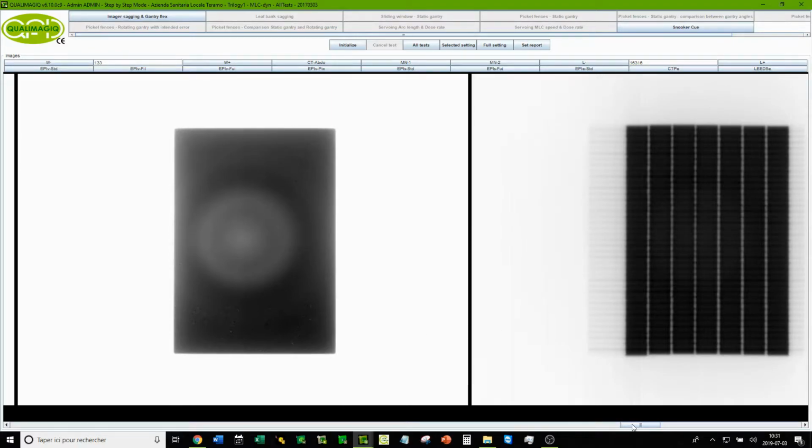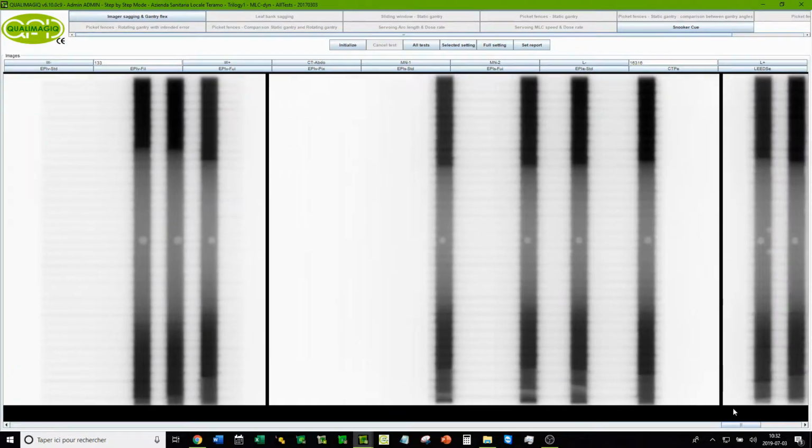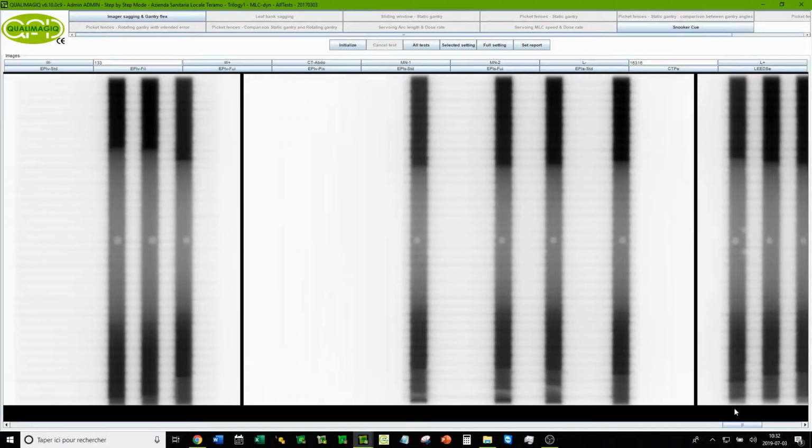The final and optional test is the SNOOKER-Q test. Our ISO test object is first aligned on the lasers and then deliberately offset laterally 10 cm in table and 5 cm in table height. So the central ball of the ISO test object is no longer at the ISO center.